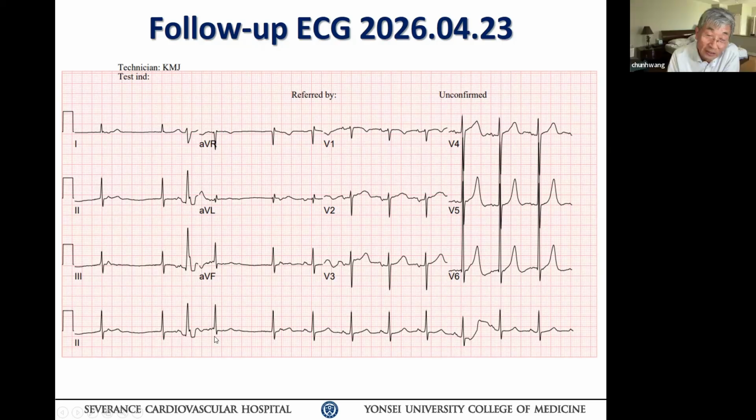The way I see it, if you look at the very first beat, the junctional rhythm with the P, but why don't you look at the P wave, and then look at the number 4 beat. There's a junctional rhythm with the P. First of all, the coupling is slightly different, the P morphology is different. So this patient has multifocal PAC going on.